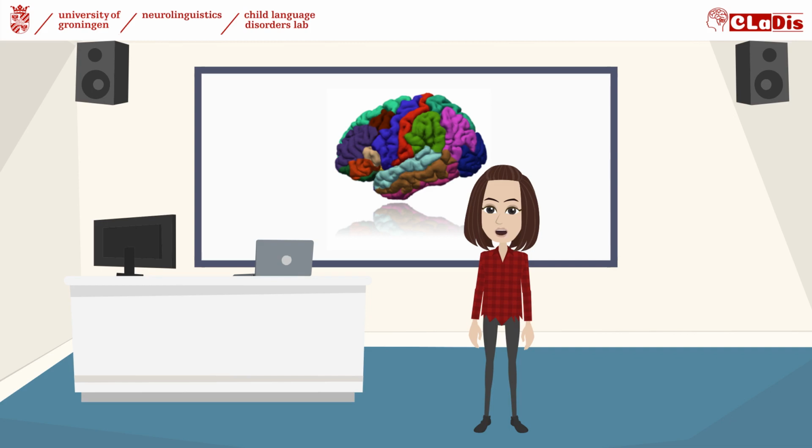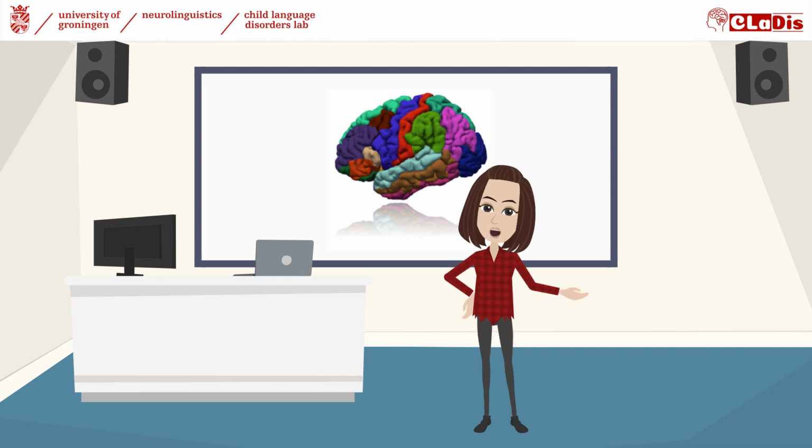Welcome to this tutorial. Here you will learn about the typical output we get from a single subject's analysis done with Freesurfer's function called recon-all. This tutorial is adapted from the one in the official Freesurfer webpage. There are lots of materials for learning how to work with Freesurfer there, so I highly recommend you follow those tutorials for more information. Here, I select only some of the steps to get you a little familiar with Freesurfer.